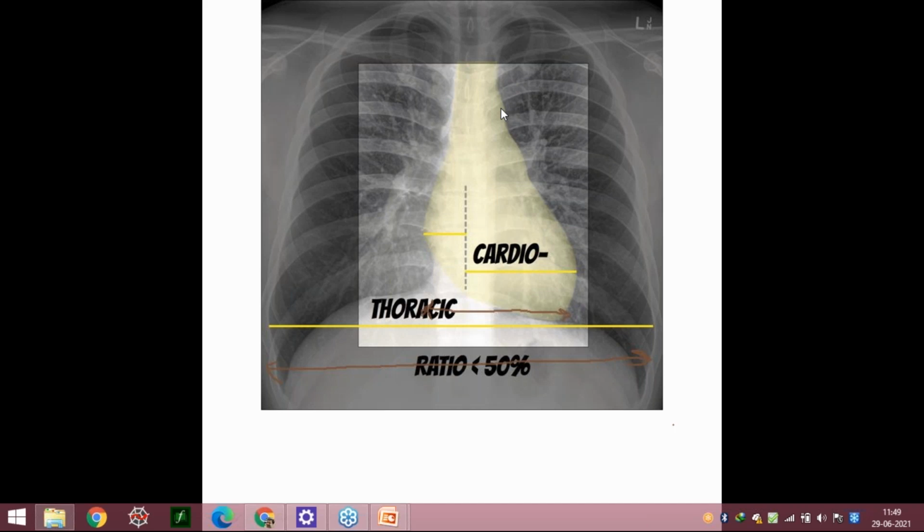Left auricle, left ventricle. Before that, Rahul, before left auricle, before left ventricle, there are two things. Oh, yes, arch of the aorta is the first thing. Second, yeah, the pulmonary trunk, not the pulmonary artery. It is the pulmonary trunk that we say. Sorry, my bad. This is the arch of the aorta. The concave aspect is the pulmonary trunk. This next bulge is left atrium, and this is the left ventricle.